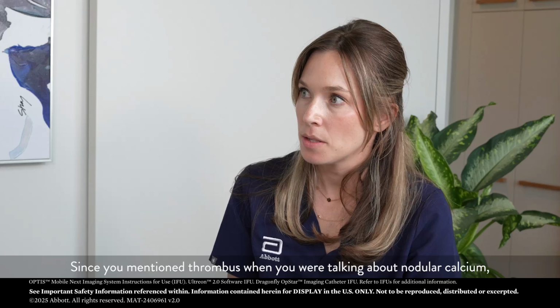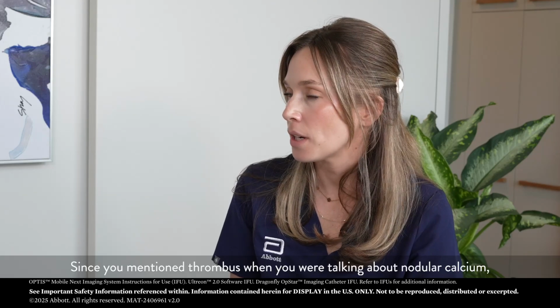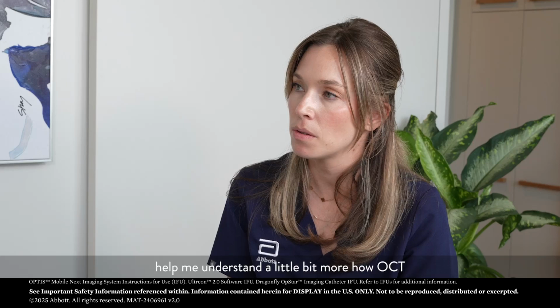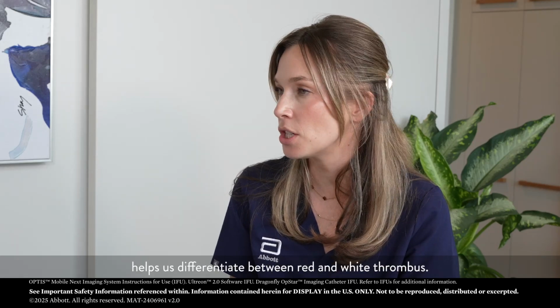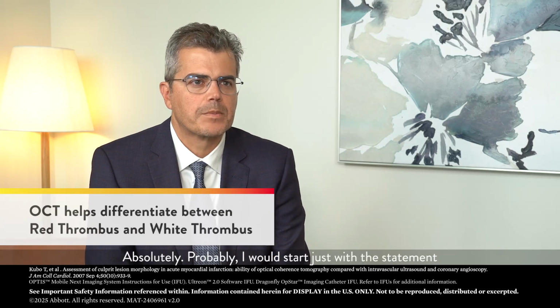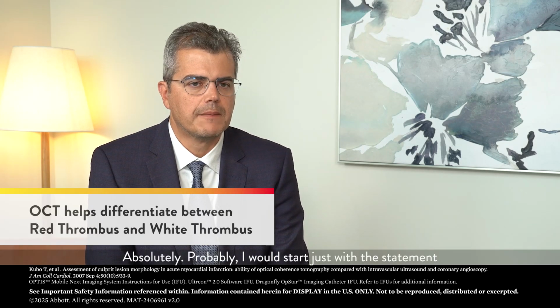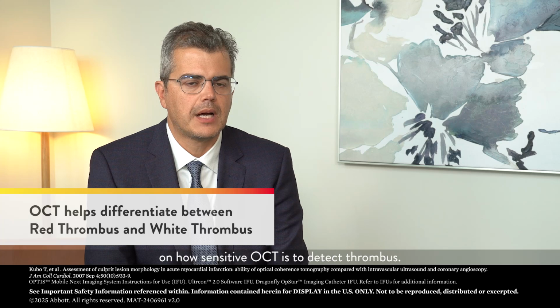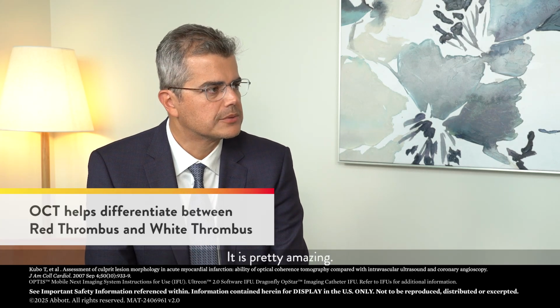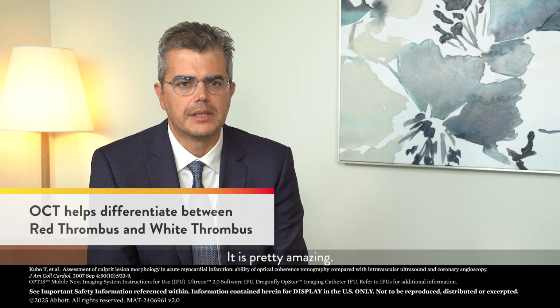Sounds good. Since you mentioned thrombus when you were talking about nodular calcium, help me understand a little bit more how OCT helps us differentiate between red and white thrombus. Absolutely. Probably would start just with the statement on how sensitive OCT is to detect thrombus is pretty amazing.